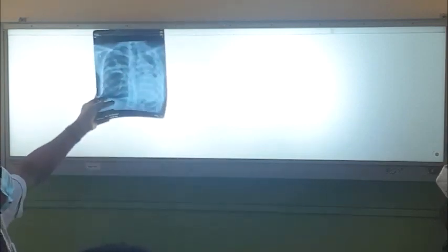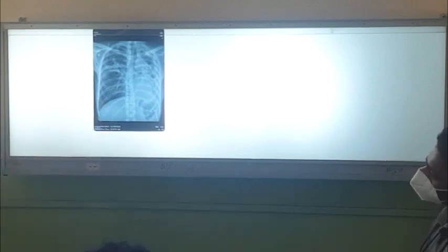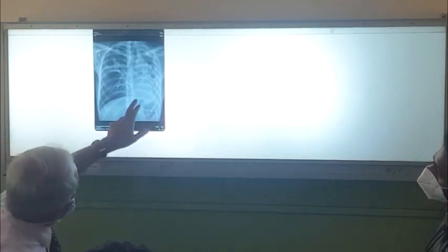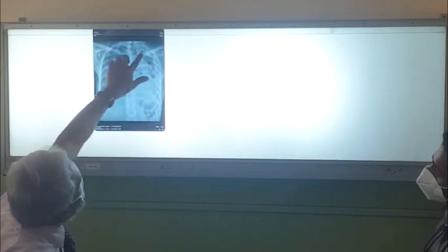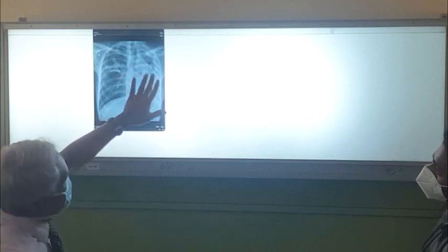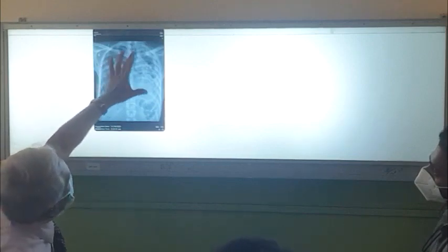Right. Again, post-TB patient, but lot of things you can see. So left side, now you can't see the cardiac shadow here, it is shifted there. You can't see the hemidiaphragm, you can see the descending aorta. So everything whitish with a dark area suggesting cavity. So it's a fibrosed left lung with a cavity, right? And the trachea, because everything collapsed.